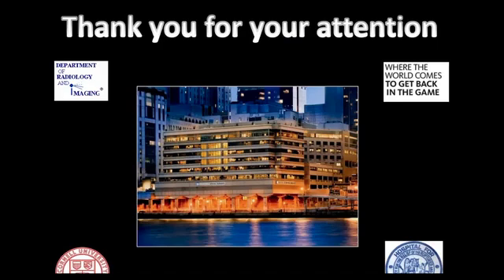I don't measure it, but some colleagues in my practice do. When you want to use mild, moderate, and severe, basically you separate it into thirds of what it should be. Mild is 1/3 narrowing of either the foramen or the central canal or subarticular zone than what you think it should be. Moderate is 1/3 to 2/3, and severe is greater than 2/3.